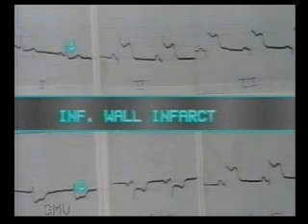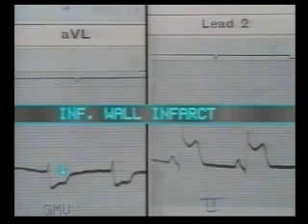The third type of ST segment depression is due to myocardial ischemia and infarct. At the onset, let us clear our mind from the reciprocal ST segment depressions in acute myocardial infarction. This is inferior wall infarct, where leads 1 and AVL show ST segment depression and 2-3 AVF show ST segment elevation. The anterior and inferior group of leads show opposite effects on ST segments.